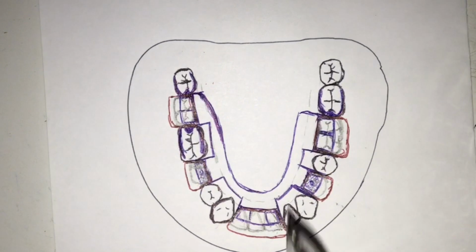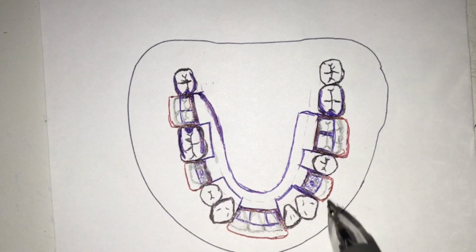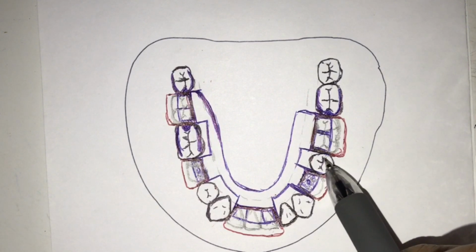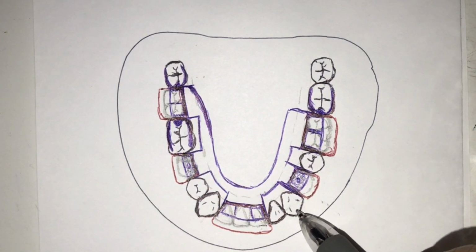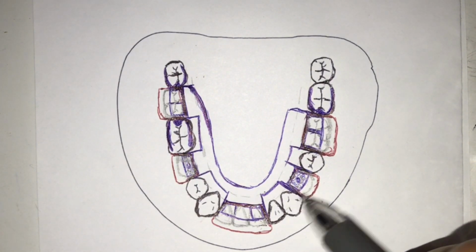If you're going to ask me if I need further support for this case, I actually do. But this one is again a pier abutment, so I'd rather not place any form of load on this tooth, may it be a rest or whatsoever, because it may not be able to carry the load. And this is a mandibular canine, so it's not ideal to place a lingual cingulum rest.